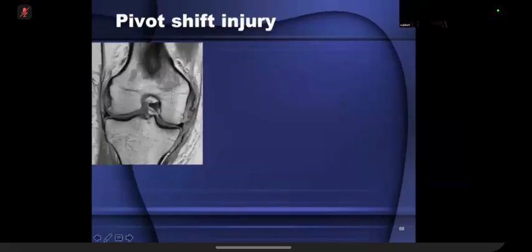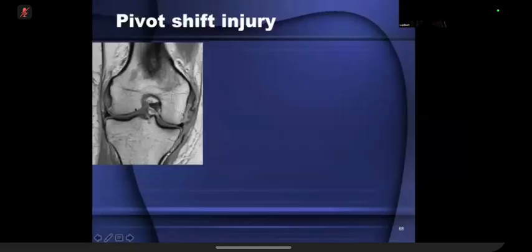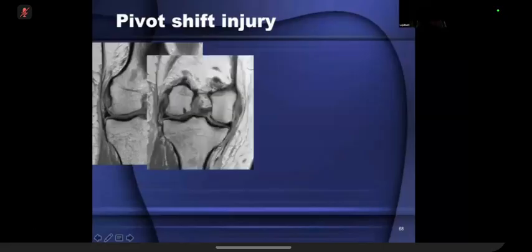Because in this case, what happens is that you've got your foot firm on the ground and injury coming from the lateral side, you can imagine that the knee would be bent towards this side. And once it bends towards this side with additional rotation, the ACL is ruptured. These two will bounce together, and then that would result in injury of the MCL because of the increased angulation present coming from this side and this side. This ruptures. You've got bone bruising here, and then once the force is released, you get a counter-coup injury on the medial side. So that's a classic pivot shift injury.